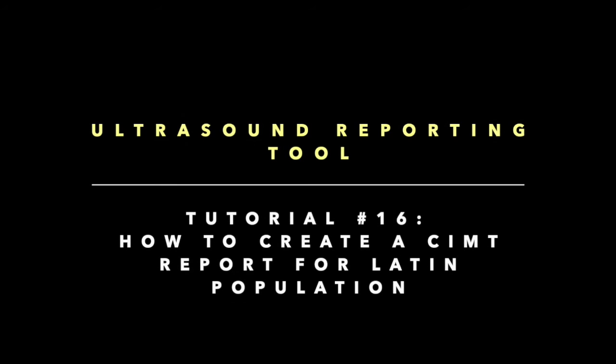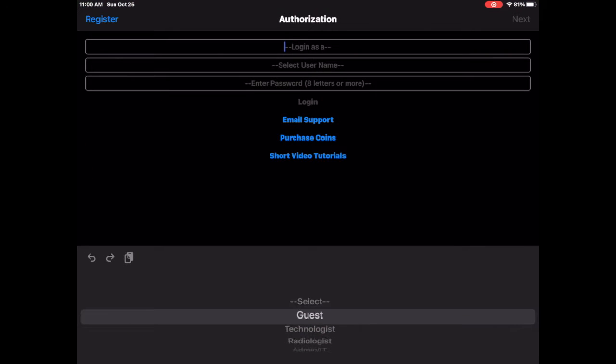Tutorial number 16, How to create a CIMT report for Latin population. After launching the app, log in as radiologist.